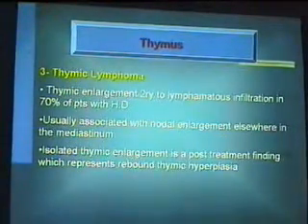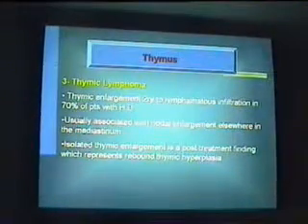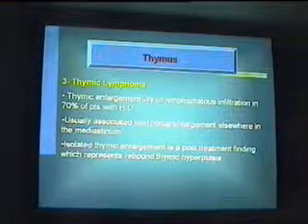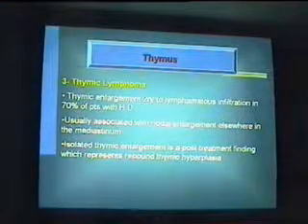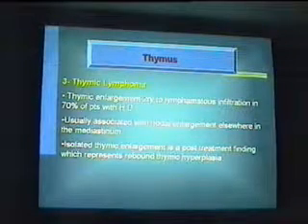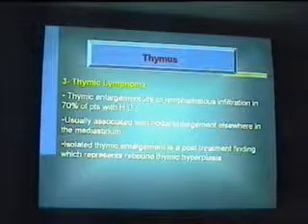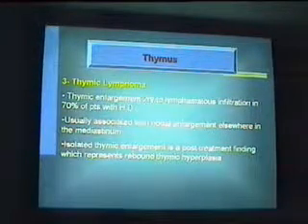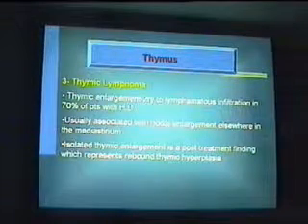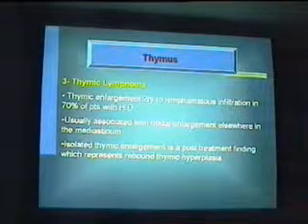ثالث حاجه يبقى اول حاجه كانت مين؟ الثايموما. ثاني واحده جيرم سيل تيومر. ثالث واحده الثايميك ليمفوما. والثايميك ليمفوما دي بتبقى جزء من الليمفوما of the mediastinum يعني الليمفوما affecting the patient، وشهيره جدا في الهوتشكن patients ان يبقى الثايمس involved بالليمفوما. ونلاقي معاها بقى additional mediastinal lymphadenopathy whether hilar or paratracheal.